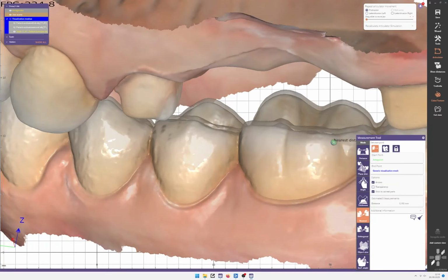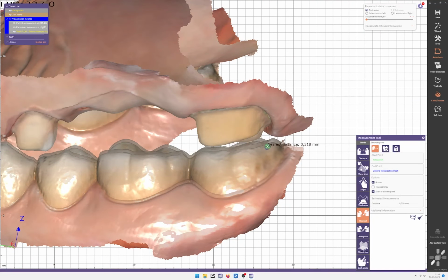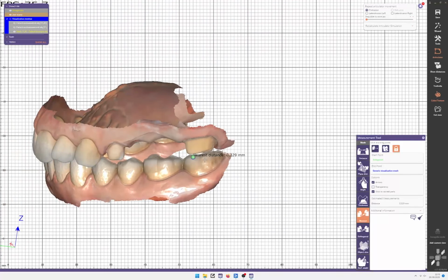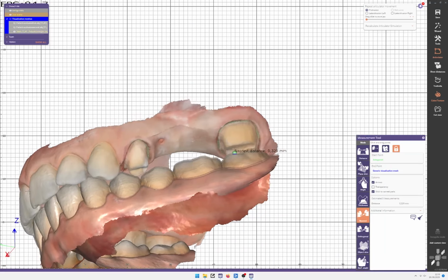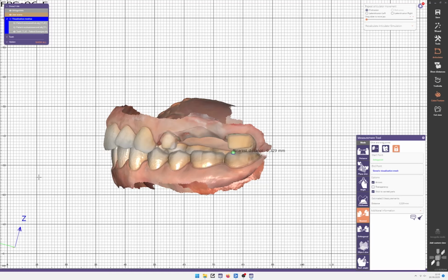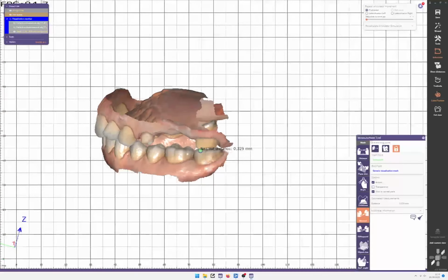especially on the back, because the back gets amplified by the 3-to-1 articulator rule much more. So if you have like 300 microns of a higher bite here, you're gonna have an open bite at the incisors, let's say half a millimeter, and on the incisal pin, if that would be in the articulator, it would be like 1.5 millimeters. So because it gets amplified the more forward you go.